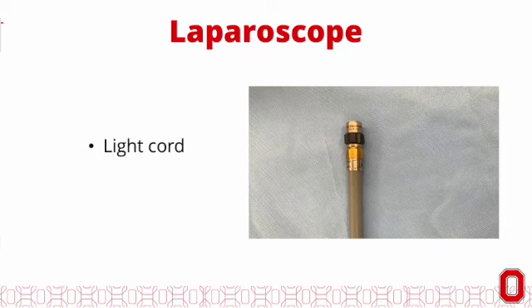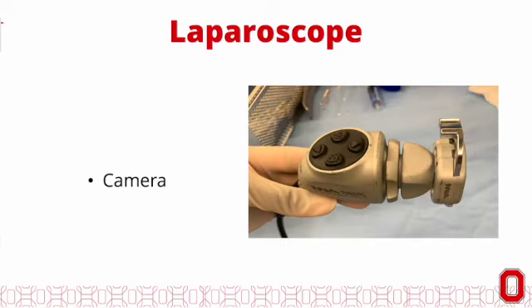At the base of the laparoscope is a camera with buttons on top controlling settings on the monitor. It is important to keep the buttons up and level while manipulating the camera, as this controls the horizontal view, often referred to as the horizon. The buttons control light settings and ability to record or capture an image. If an angled scope is used, such as a 30-degree scope, spinning the light cord around the base changes the angle of view.